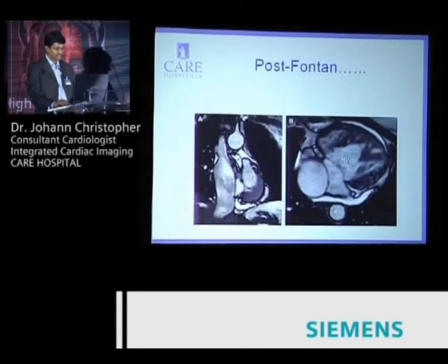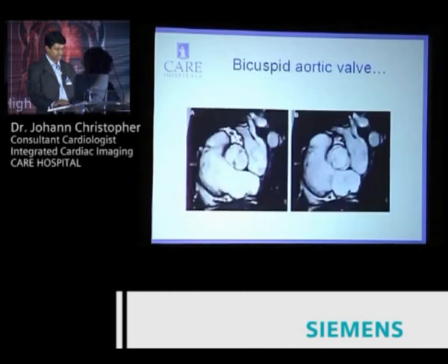And this is an arterial switch. This is what I was telling you about, the extracardiac baffle that we use for a Fontan surgery. And we like to see the flow here because thrombosis is quite common. So we use the VEC imaging and the cine imaging to characterize this particular baffle.